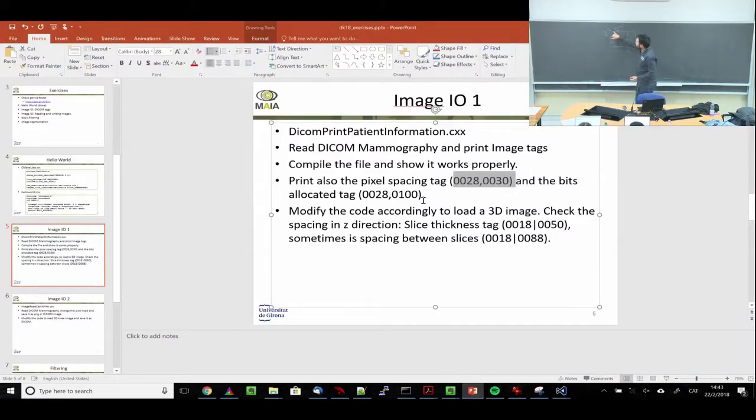I'm asking you what is this spacing in the image that I'm providing. Okay? And I'm also asking what is this spacing in Y. Okay? Because that's really important when you do some image processing in the medical images. Okay? And this is a 2D image.